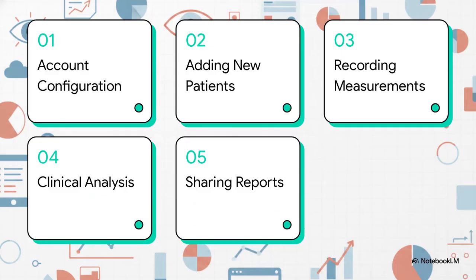We're going to follow a very logical 5-part patient journey today. We'll start with account configuration, move into adding new patients, hit recording measurement data, dive deep into clinical analysis, and wrap up with sharing reports.